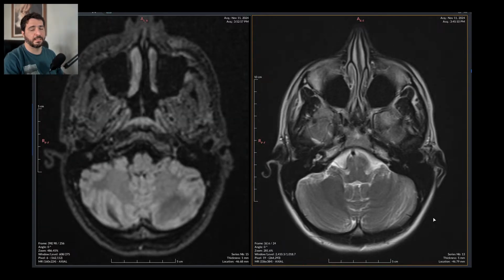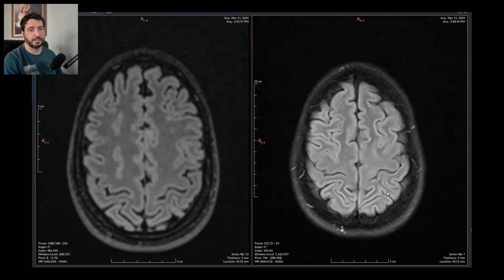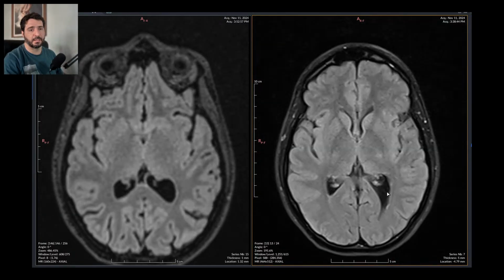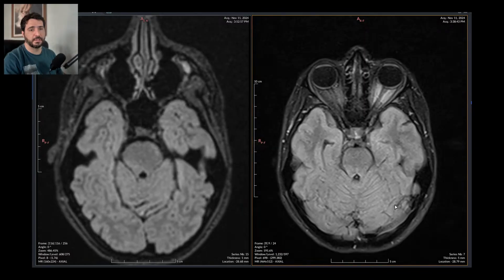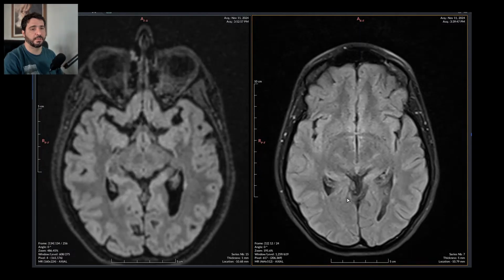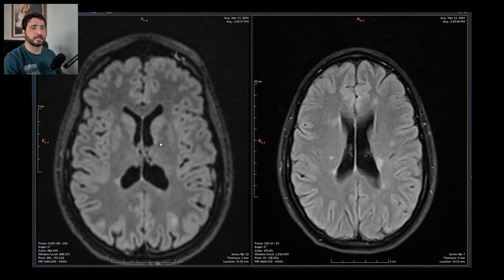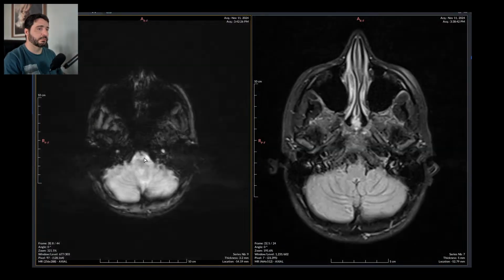This should be at least a 2.5, at least half the thickness to be a proper scan, but no, they have to make it fast to make a lot of money, so they couldn't care less, and we end up not being able to see small sites of disease because they won't show up in such a thick slice.